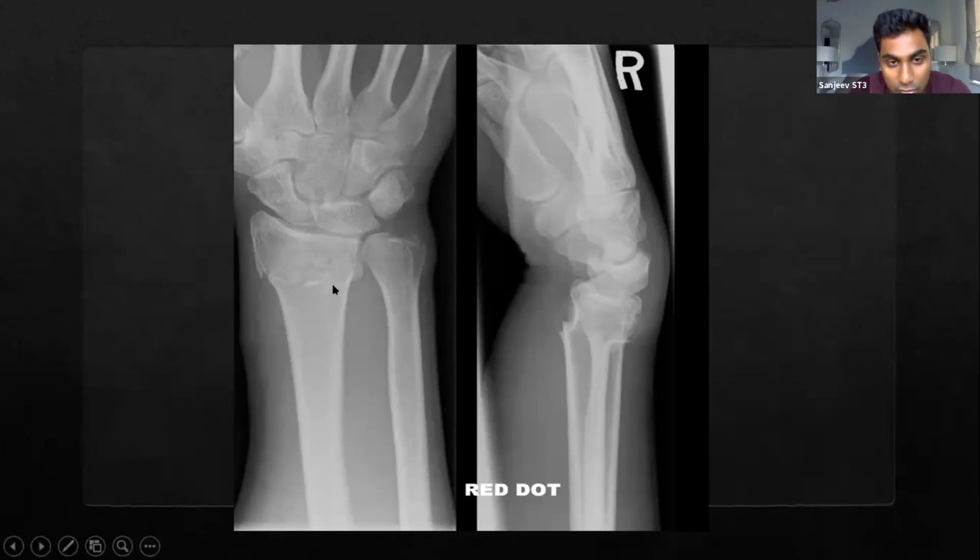So say it's a transverse fracture. I don't know if I can convince you the fracture is orientated this way. Yeah. And just be careful about your dorsal versus volar. So the dorsum of the hand is this bit, if you can imagine my hand looking up like that and comparing yourself.